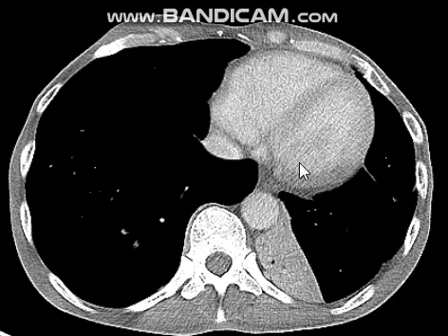As I mentioned before, whenever you see the heart, the anterior 1/3 here is the middle lobe. The anterior 1/3 here is the lingula. The posterior 2/3 here and here are the basal segments of the lower lung lobes.